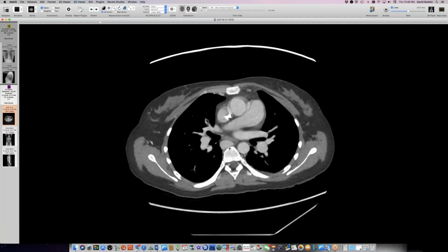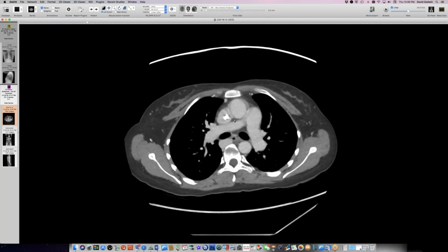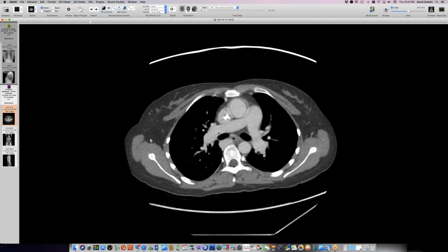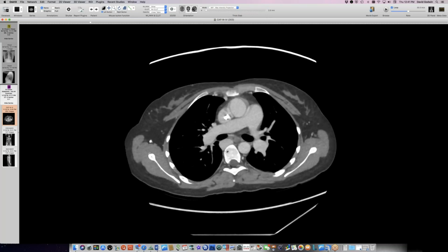Yeah, I was wondering if it was going to end up being bilateral left-sidedness. But the pulmonary artery is not going over this bronchus, so it's not left isomerism, because this pulmonary artery is in front of, not over the top of the bronchus as it is on this side. So on the left side, the pulmonary artery goes over its bronchus. When you have left isomerism, the right pulmonary artery will also go over its bronchus.